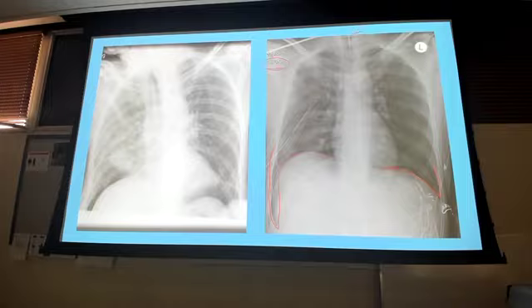So, a couple of different clues on that. The chest tube, absolutely, you're right, tells you pneumothorax or hydro/hemothorax or both, I don't know. But with my deep sulcus sign, I can be confident it was a pneumothorax, and only because I was told this chest x-ray was supine. Because this is a supine chest x-ray finding. You remember that? I know it was a while ago. Trying to bring it back. Okay.